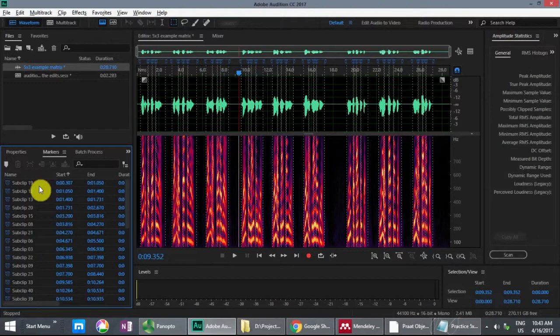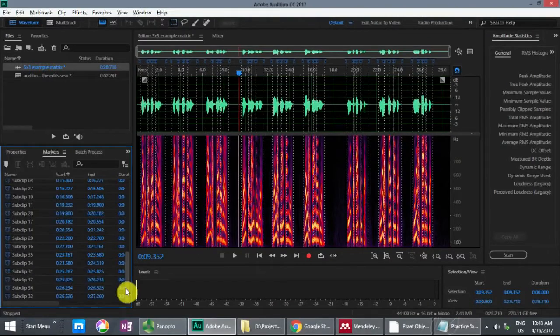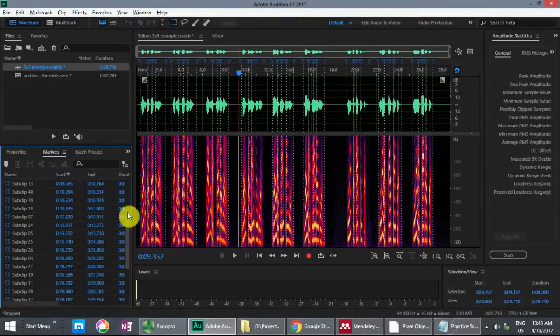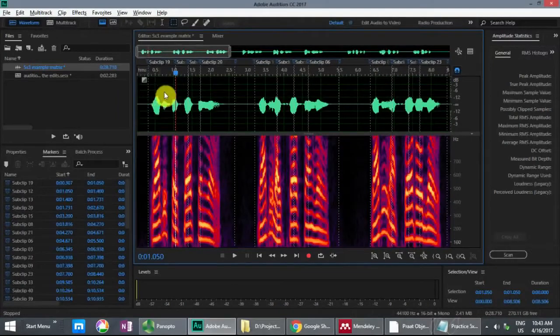Unfortunately, because of the way Audition numbers their subclips, and they don't start over at 1 once you delete subclip 1, unless you go straight through 1 to 36, it's not going to be super easy to tell from looking at the list. So we'll just count here.